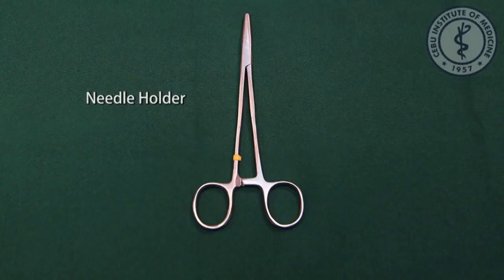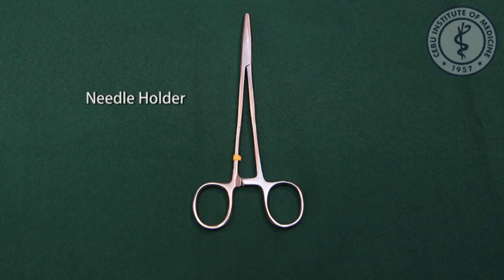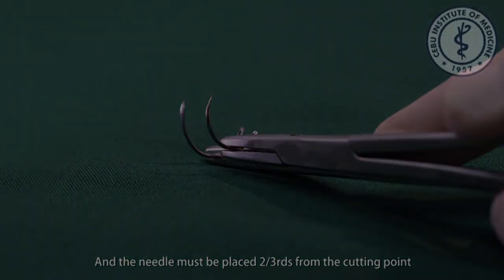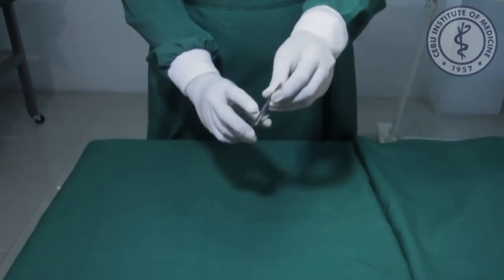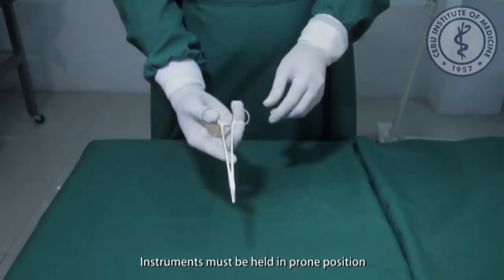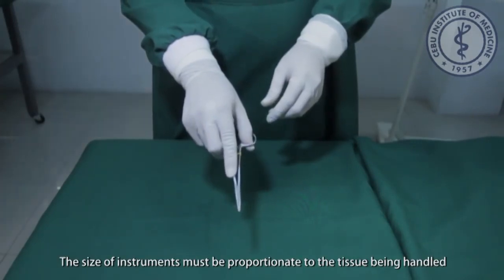Needle holder must be held in a tripod or palming technique, and the needle must be placed two-thirds from the cutting point. Handling of surgical instruments. General guidelines. Ring instruments must utilize the ring and thumb as stabilizers of the instrument handle. Instruments must be held in prone position. The size of instruments must be proportionate to the tissue being handled.